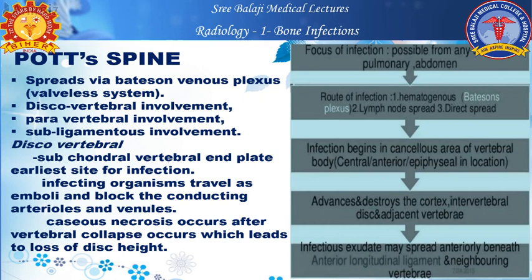These are the common sites where it can involve the vertebra, and discovertebral involvement is seen as the earliest lesion with adjacent discal involvement.